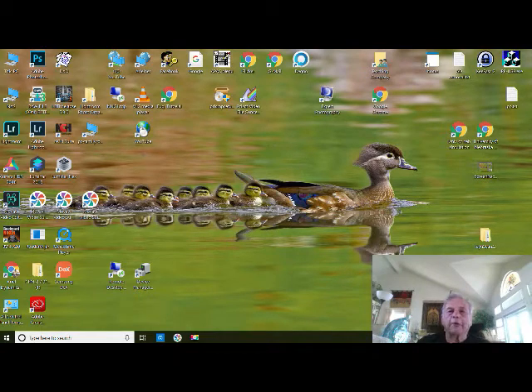Hello, this is Bob Wainwright, physical therapist with Ariel Dynamics, and we're going to show you how to do a 2D biomechanics project from your cell phone. Step 1 is record the video, which we've done prior.